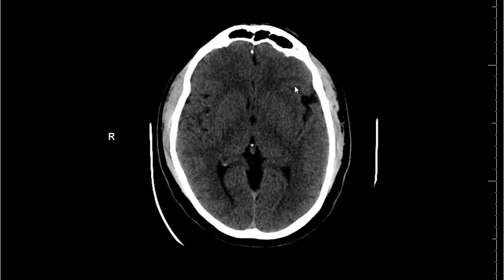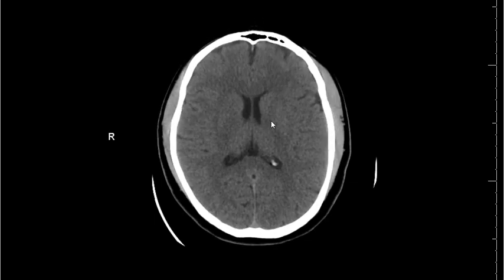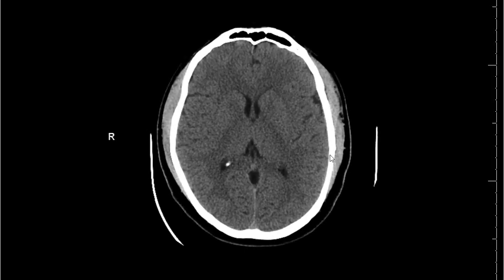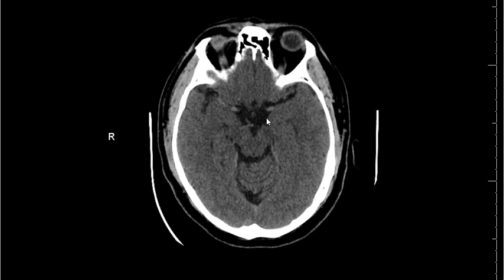Now that we're done with that, we want to evaluate the extra-axial spaces, moving to an intermediate window where we have not so great differentiation between the gray and white matter. However, the margin adjacent to the bone is more defined. Again, the parenchymal window, the margin near the bone is blurry. Moving to the intermediate window, we still cannot evaluate the soft tissues. And on this window, in addition to the extra-axial spaces, again, visualizing the ventricles for small amount of blood within the ventricular system, visualizing the vessels is also good.